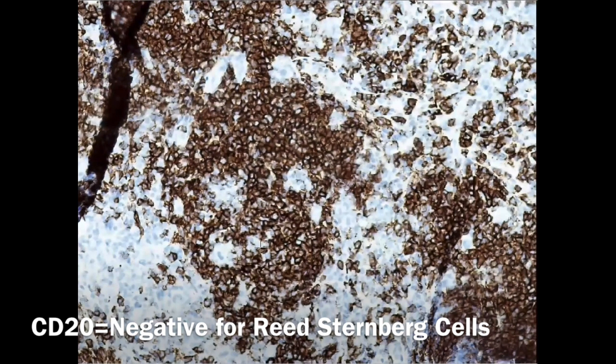Okay, so the focus is adjusted. If you can look at these small cells, they take the stain. Because they are small, they are having the smooth membrane. Look at this one with a gap here.